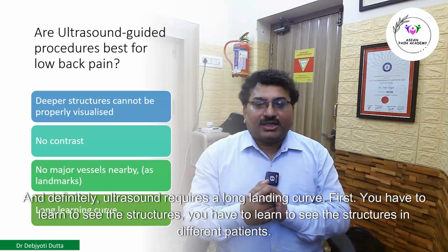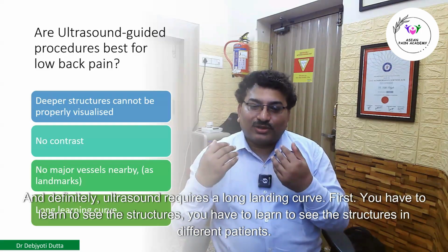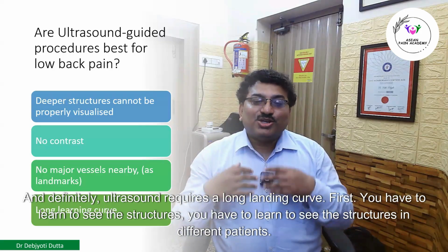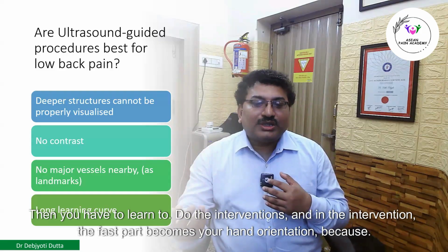And definitely ultrasound requires a long learning curve. First, you have to learn to see the structures. You have to learn to see the structures in different patients. Then you have to learn to do the interventions.